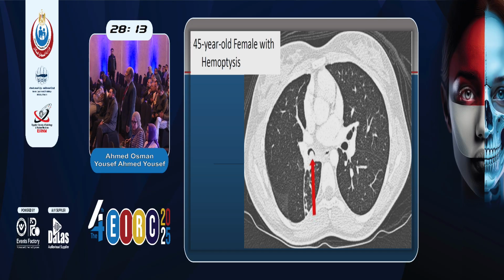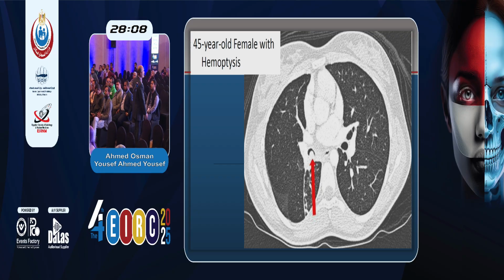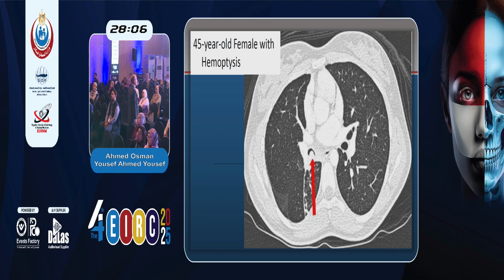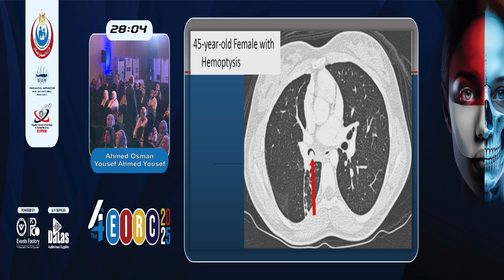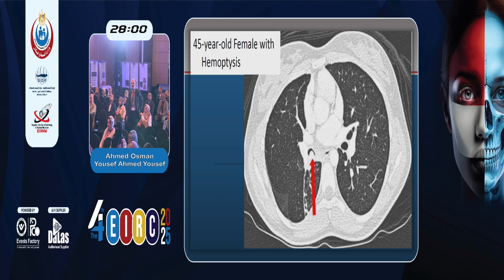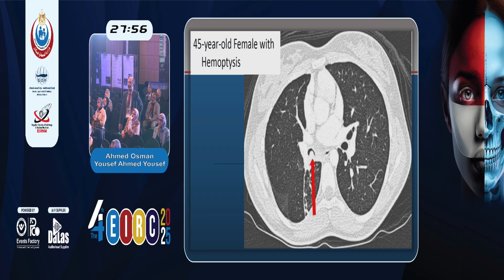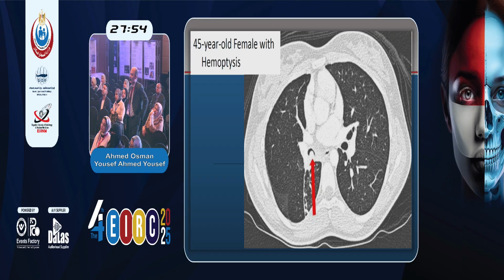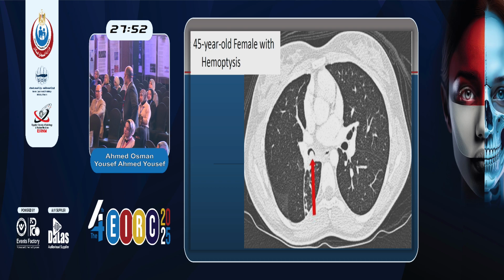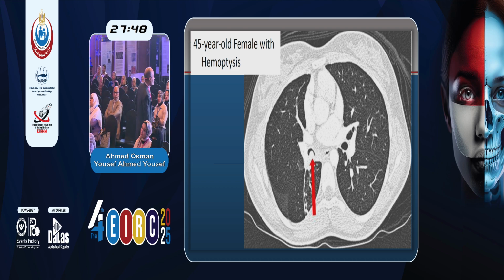Another patient, a 45-year-old female with hemoptysis. What can you see? Any volunteer? Yes? Anyone?